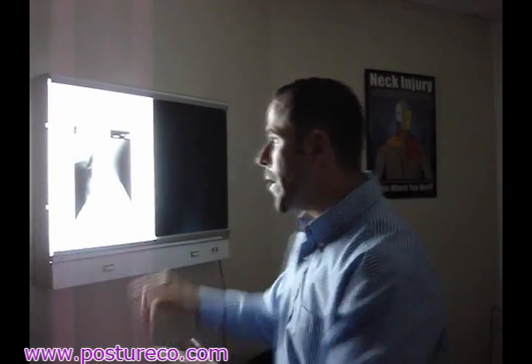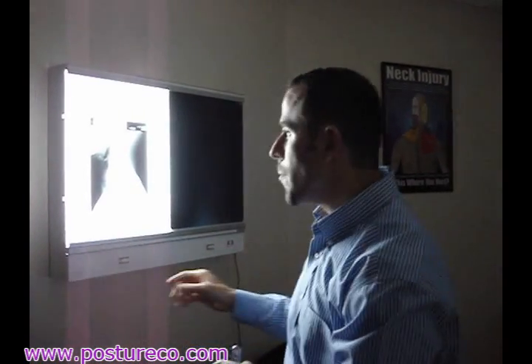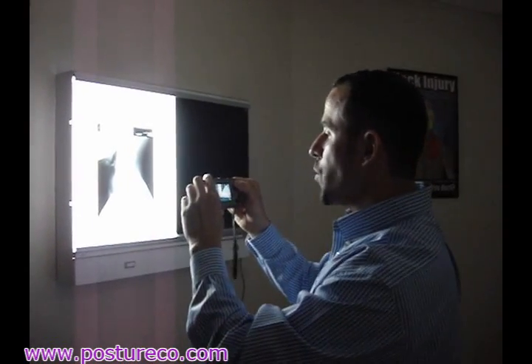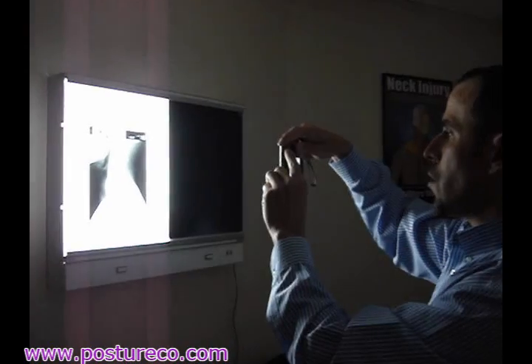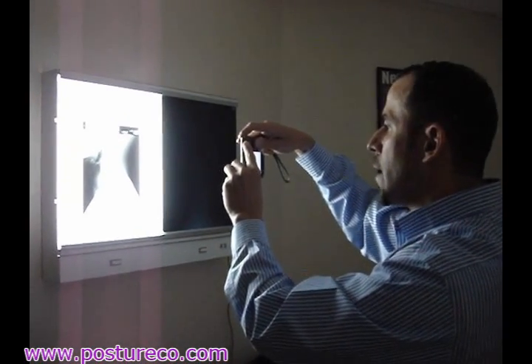So when you look at these images on your computer, make sure that they don't look out of square. If that shows up, all you have to do is change your zoom factor to about 50% between far out zoom and close-up, and then stand a little bit farther back and bring the camera in. That way you get a nice square image of the X-ray.